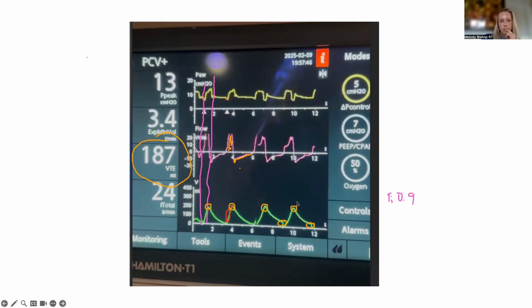So I think in the totality of it, a few things. One is that I'm not exactly sure what's going on here. It's interesting, because it looks like the pressure goes up, right? This flow pattern is certainly weird because it should go up, but it doesn't. It doesn't go up till here, till you're into the breath. And then the pressure is pulled down. So does that mean, in the first half of the breath, you're not getting any flow because there is no delta being generated because there's auto peep? Then in the middle of the breath, the patient turns on and starts using their muscles of inspiration so forcefully that they're pulling flow. So now you actually have a flow. If you ask me, what does that resemble?